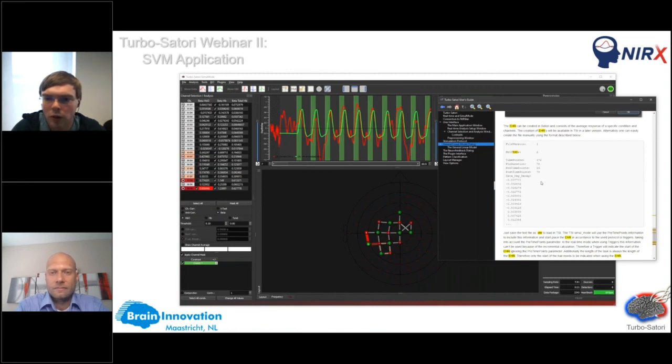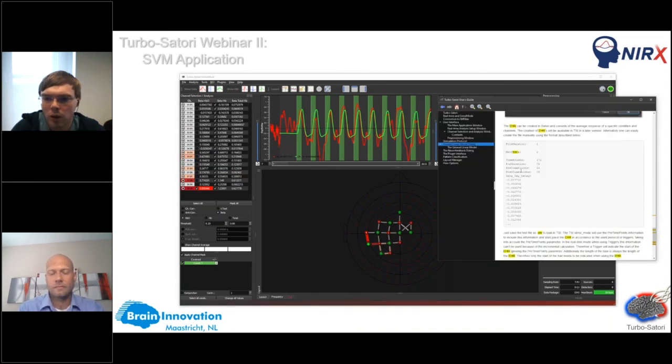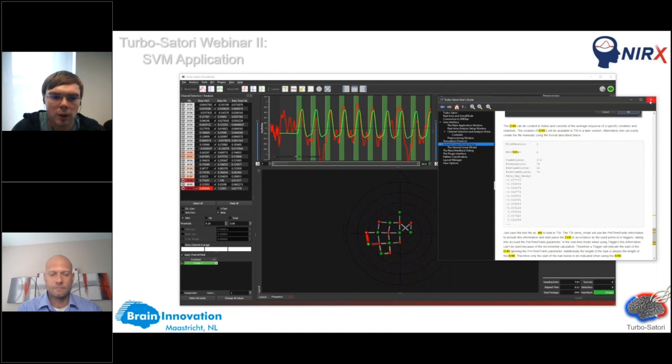I'm not sure if I have an example one available, but in general it would be similar to this curve. It will basically reflect this specific curve in the task. The thing is that the EHR will also be available for different conditions. So here you see that you have the number of EHRs, for example, 2. So you can make a specific curve for each individual condition, which you can then use. But if you're interested in using it, please drop us an email and we will try to work with you to find a solution as soon as possible.